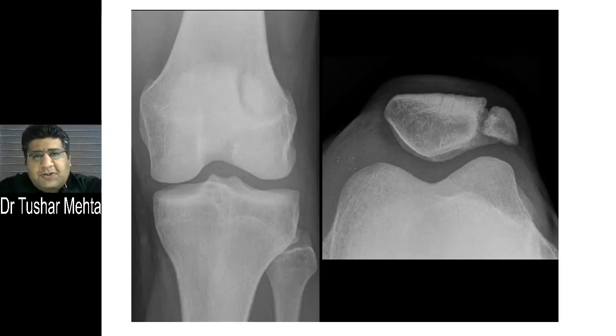Let's talk about the topic for the day. We will not be actually talking about the topic first. We'll be looking at this X-ray. We'll be looking at this image first. What do you see in this image?